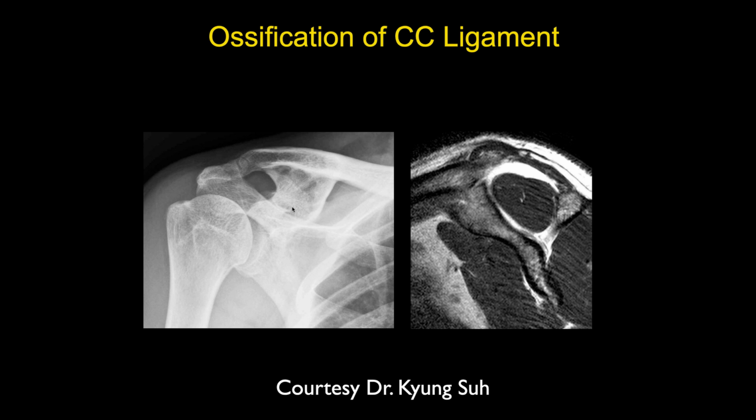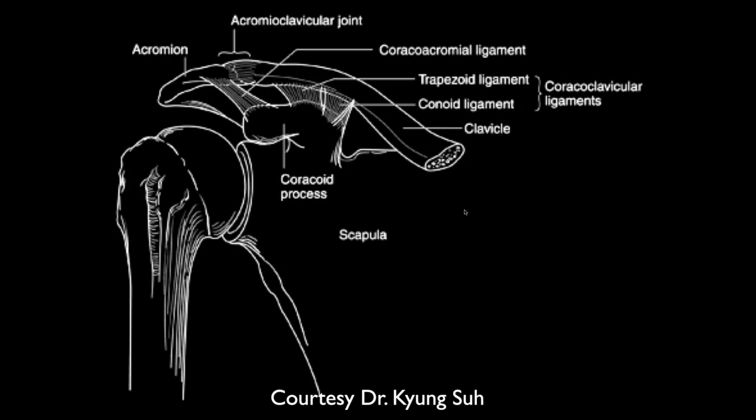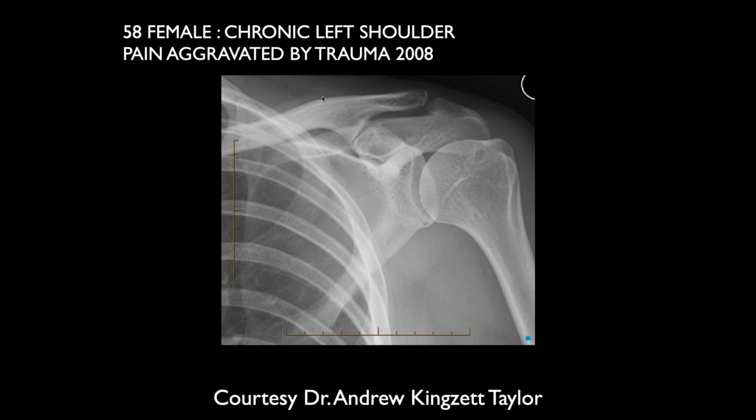They're ligaments and they ossify. They calcify from all the blood and then they ossify, and there you have it. And it's probably a type 2. See, both of these ligaments ossified in that particular patient. I had one ossify on me after surgery.